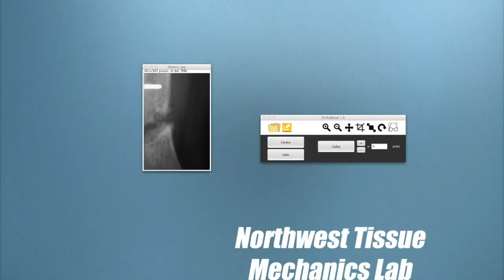Once our region of interest is cropped, we can begin placing anchors which define the cortical fragments. To do so, we begin by clicking Cortex. You'll notice that the text updates to say first cortex to signify that we are selecting for the first cortex. When selecting anchors, it is important to note that the first anchor must be selected near the fracture site. Following anchors must move along the cortex towards the border.